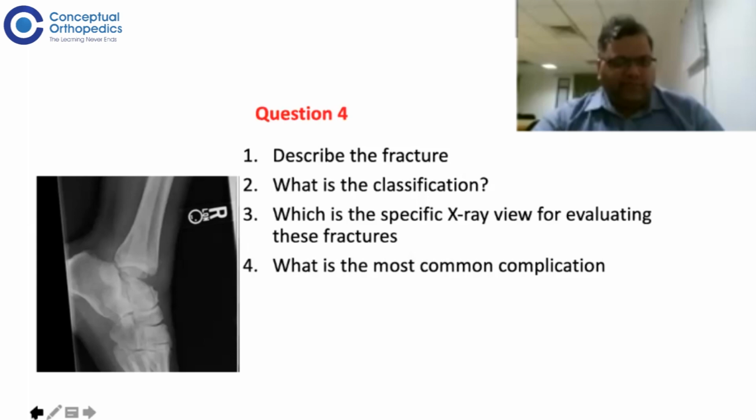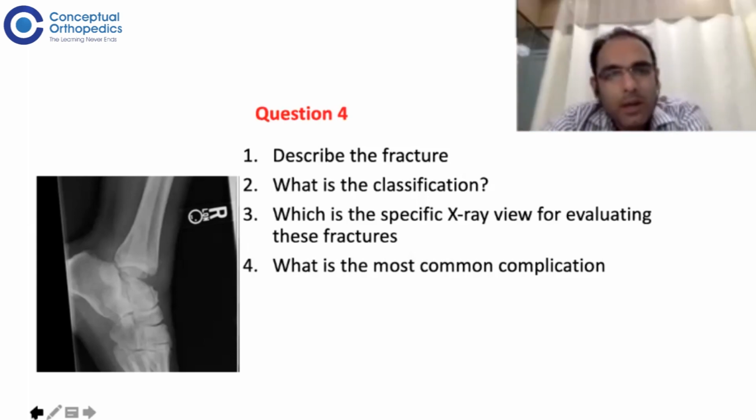So I think when we're dealing with the trauma stations, most of the time you would be shown an X-ray, and you would be talking about the fracture and describing it. If you look over here, this is a lateral view of the ankle showing the tibia, fibula, calcaneum, and talus. But if you look at the proximal portion of the talus, which articulates with the tibiotalar or the subtalar joint, is missing. You can probably see a bit of shadow around this area.